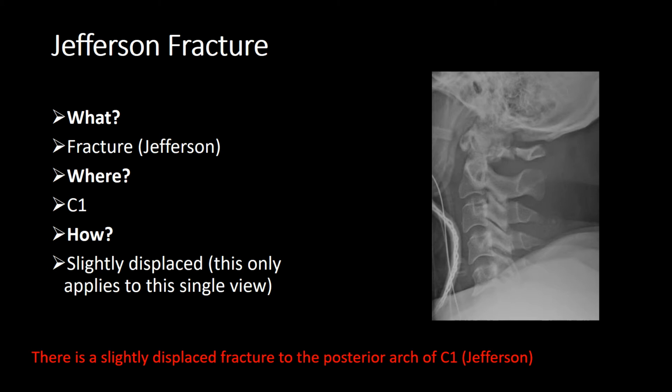So we run down our anterior vertebral line, which runs along the anterior cortex of the dens, down the anterior vertebral body of C2, C3, C4, C5. Now you'll notice that C5 in particular has quite a big spur. Don't follow around the spur, otherwise you'll get an abnormal anterior vertebral line.